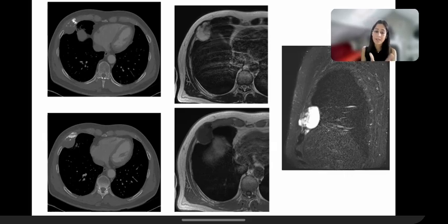Now, there is a definite discrepancy. On imaging, this is aggressive. On imaging, this is a chondrosarcoma, no matter what the pathologists say. So we discussed in the meeting and we were like, we're not happy with your diagnosis. Of course, there are a lot of issues with sampling. We can't go into detail with them, but that'll also take time. So we were really, really concerned with the imaging of this patient, and the surgeons went in and resected, and this was grade 2 chondrosarcoma.